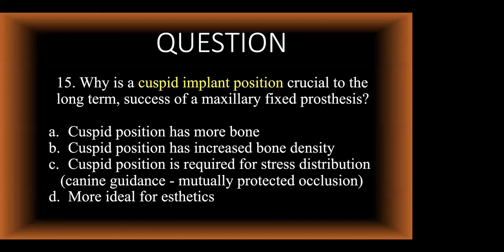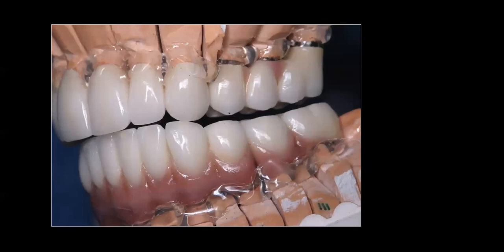And the answer is C. Very good. Excellent. 87% got C right. C is the correct answer. We always want an implant in that canine area because of canine guidance.